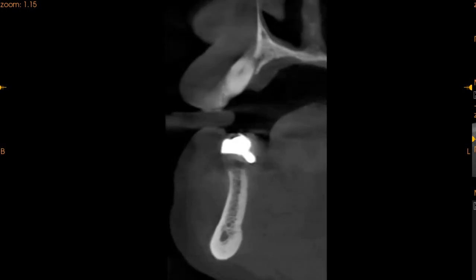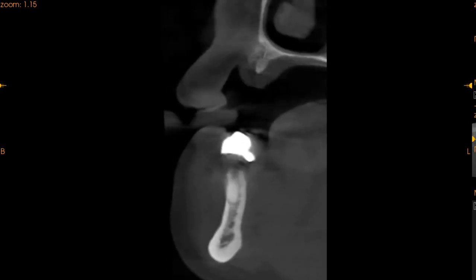The upper left canine also is not doing so well. Periapical radiolucency with significant bone loss, and immediate or delayed implant is not possible in the canine region due to the significant bone loss that we see. The central incisor here has a periapical radiolucency as well, and significantly it is grossly carious. Again, an immediate implant is going to be difficult due to the angulation of the ridge.